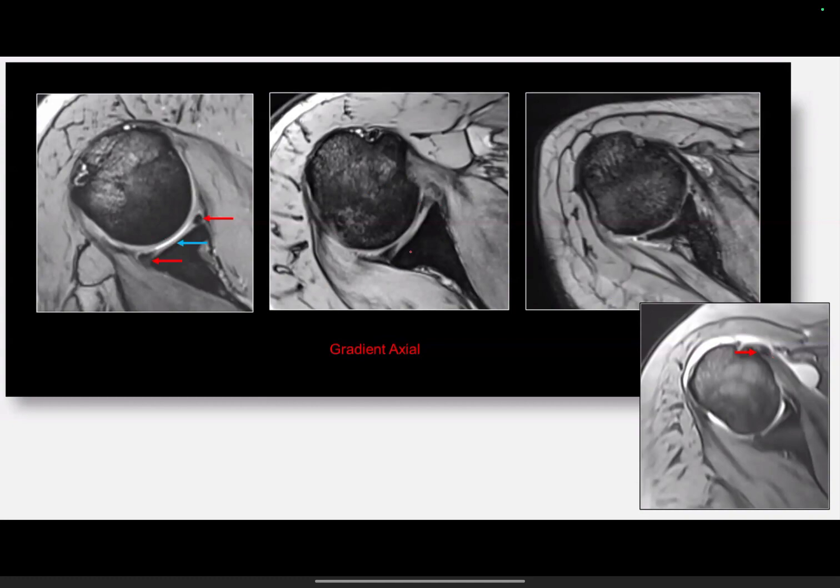In this second image you can see the posterior triangular glenoid labrum is maintained, but anteriorly this triangle is not intact. So this image shows a glenoid labral tear with capsular thickening and injury. In the third image, compared to the second and first, there is no joint space, significant cartilage thinning and significant attenuation of the glenoid labrum.